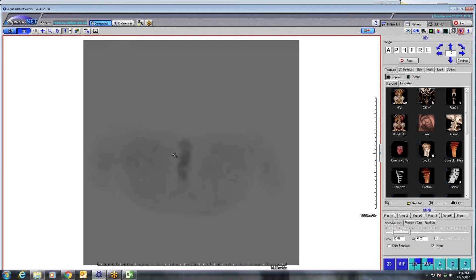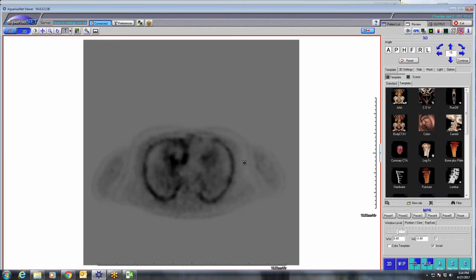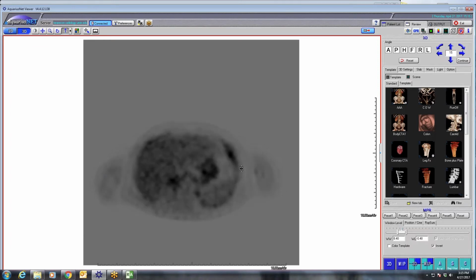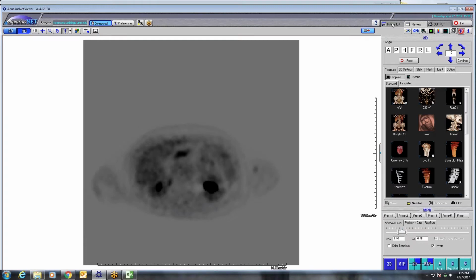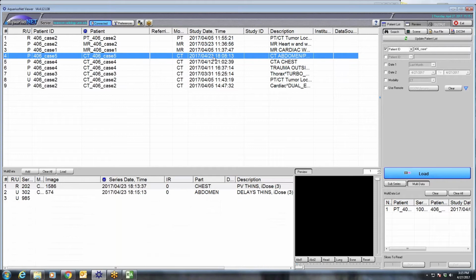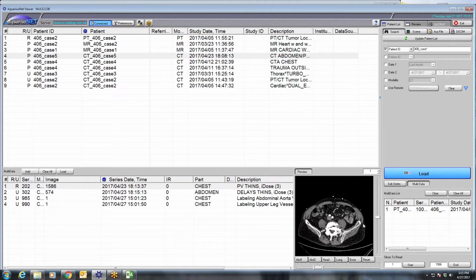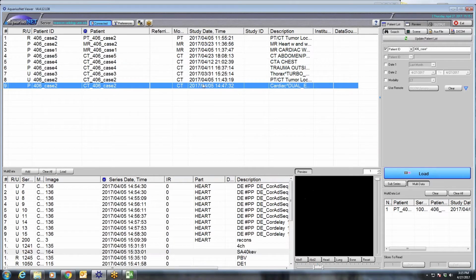Anyways, it's pretty impressive, the uptake around the pleura, the epicardial fat, and kind of invading around into the epicardium, along the soft tissue, the pericardium. And the kidney uptake wasn't that impressive, but on CT, there was a lot of soft tissue around the kidneys. So we don't have path on this yet, but given all the things that we saw, I'm pretty confident that it's going to be Erdheim-Chester, but we're still waiting to get path to 100% confirm it.